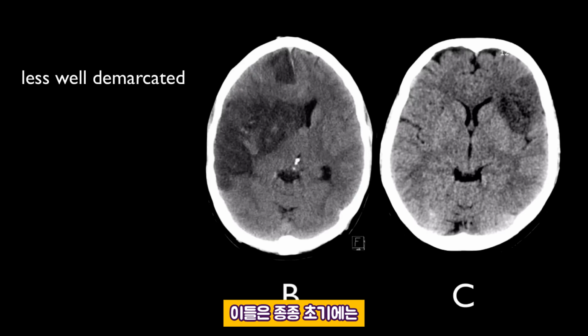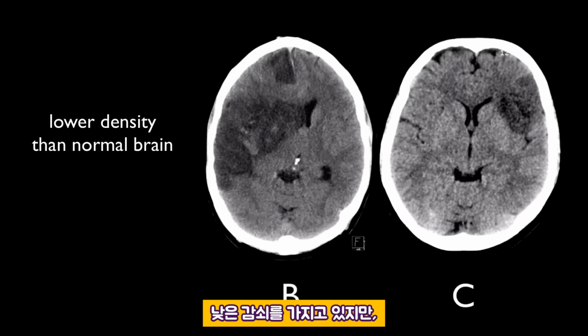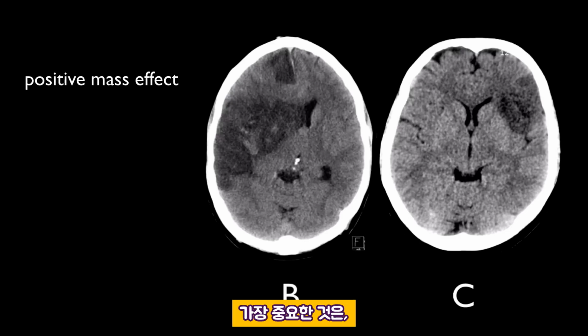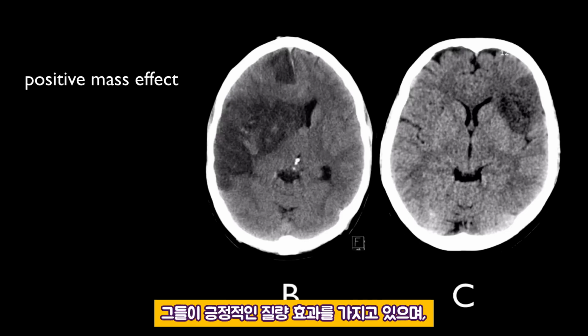In contrast, images B and C are subacute infarcts. They are often less well demarcated, especially early on, and although they are of lower attenuation than normal brain tissue, they are still very much denser than CSF. Most importantly, they have positive mass effect with effacement of the overlying sulci.